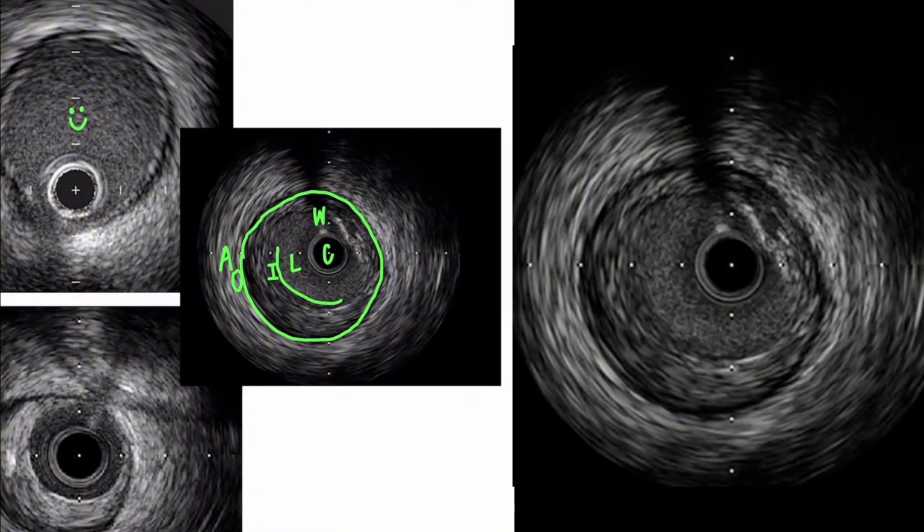So why is there this space between the intima and the media? You see where the intima starts to where the media is? Why is there this gap here? This gap here, this gap here. Let me trace out what I would call the intima in purple. All right, so what is between the purple line and the green line? Plaque. Okay, plaque builds, grows, develops between the intima and the media.